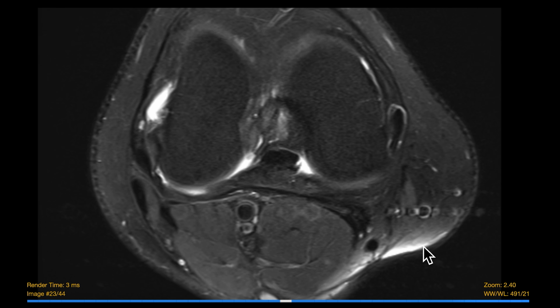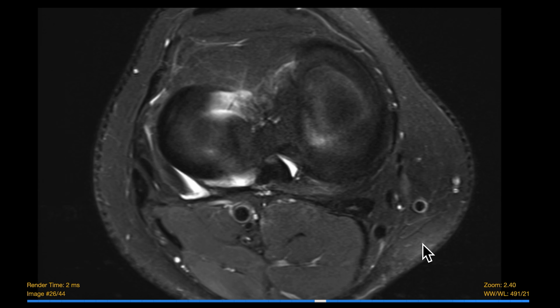This group of tendons is important because they can be torn if you've had an injury. You can get inflammation around them or a fluid collection or bursa that can cause medial-sided knee pain. They're also useful to routinely assess, as these tendons can be harvested for hamstring ACL graft reconstructions.